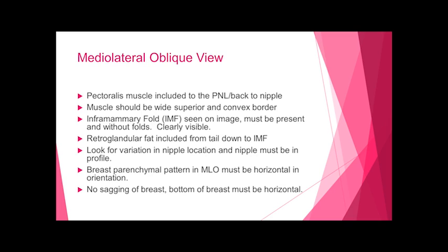If it isn't clearly seen, then the parenchymal patterns aren't all visualized. And look for variation in nipple location, and the nipple must be in profile for the MLO.